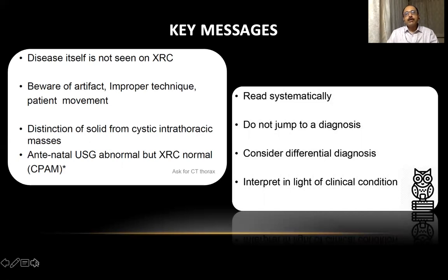We talked about the doctor ABCDE approach. Let us not jump to a diagnosis just because we have found a clinical abnormality on the X-ray, but also look at other findings, and not miss subtle associated anomalies which are there. Always make a differential diagnosis, and last but not the least, interpret the X-ray in light of the clinical condition.